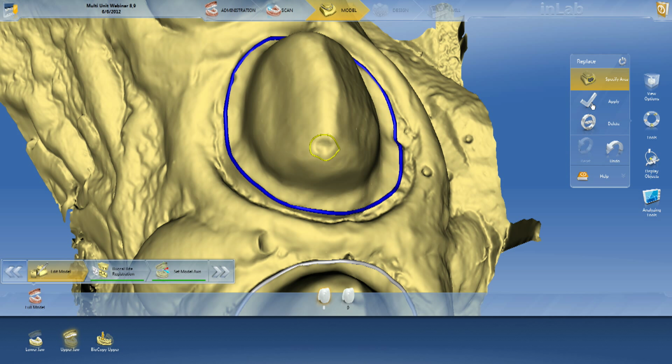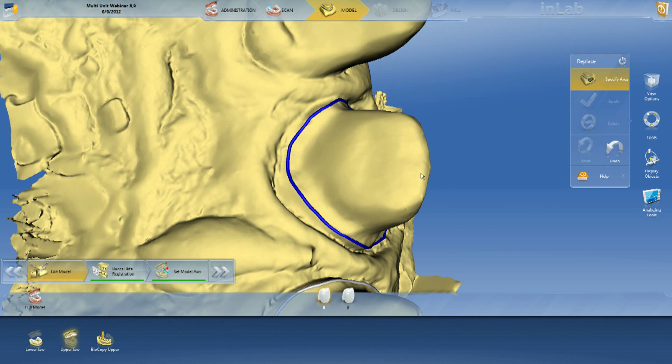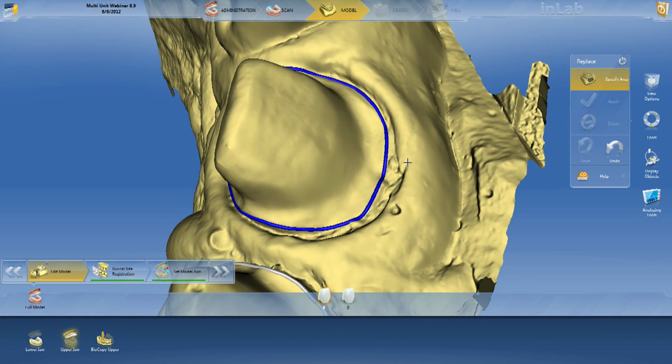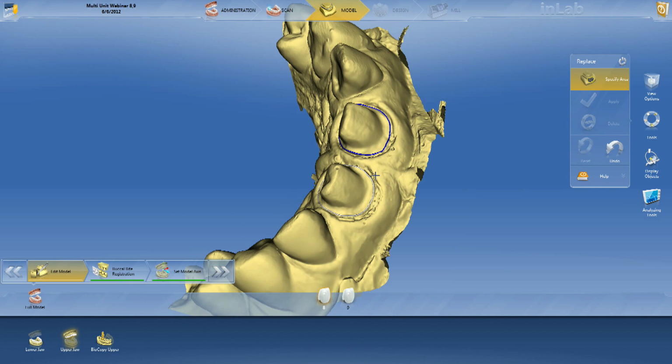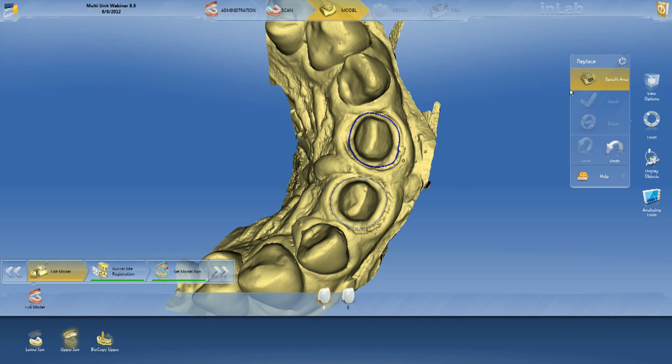Okay. And if you don't do that properly, sometimes it will give you an error. It's like if we have our little virtual wax there. I think that's pretty cool. I know all of you out there are going, ooh, that was cool. So, I just wanted to show you that.